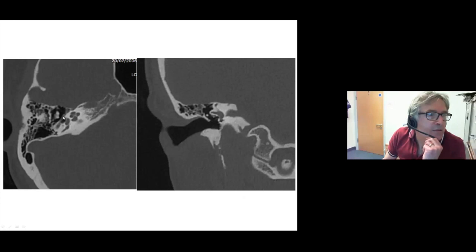So in axial, that's what it looks like. That's the horizontal semicircular canal, geniculate ganglion up at this end, and the posterior genu up at this end. And what you see is the facial nerve canal here very nicely in the middle ear cleft, below the horizontal semicircular canal as that little blister.